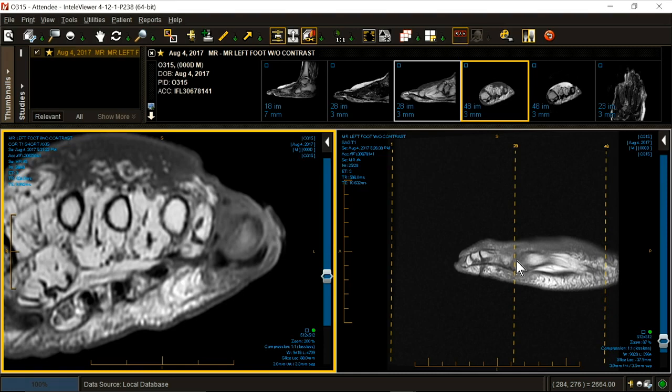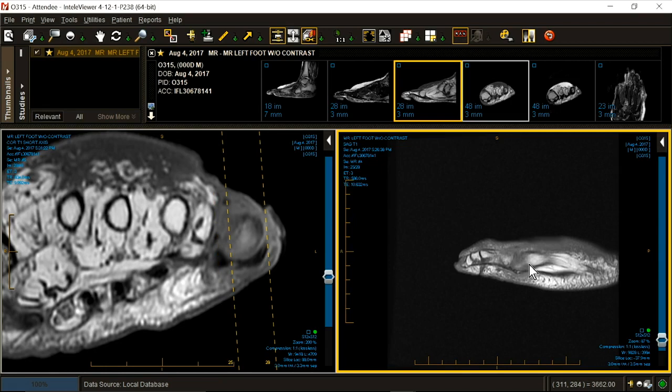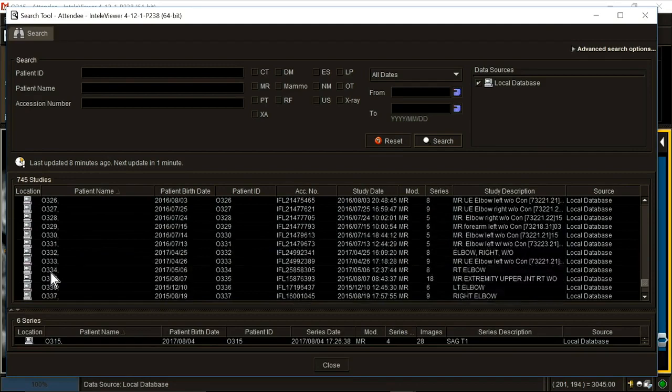Sorry? Is there septic arthritis? There absolutely is. Septic arthritis and osteomyelitis. No air, no gas. It is in the joint. There's very subtle involvement of the base of the proximal phalanx. You are correct. 250, 250.